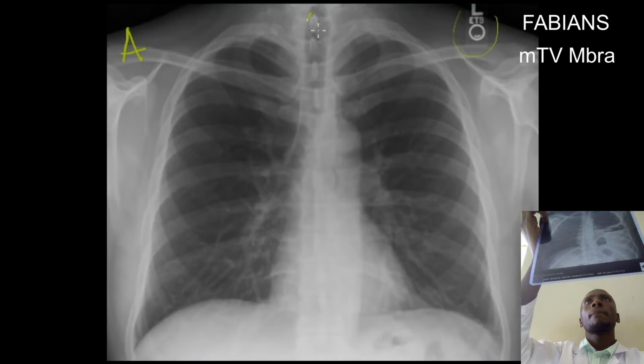Now let's go. The first thing I want us to talk about, let's begin with the letter A, which represents the trachea. As I'm shading the trachea, it comes down, then makes branches, and on the other side makes two branches.